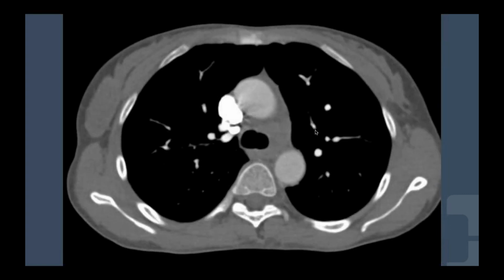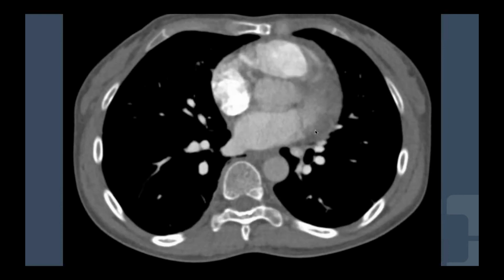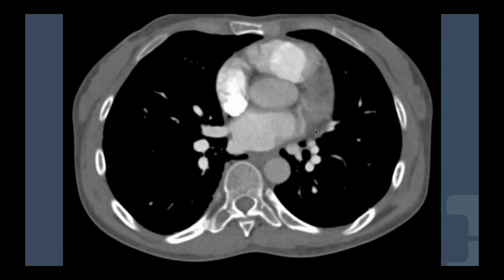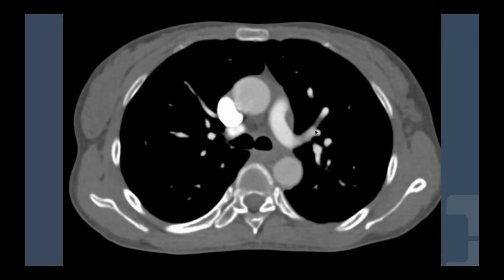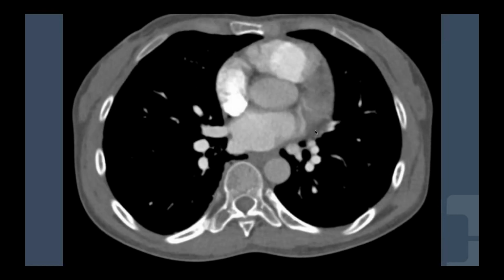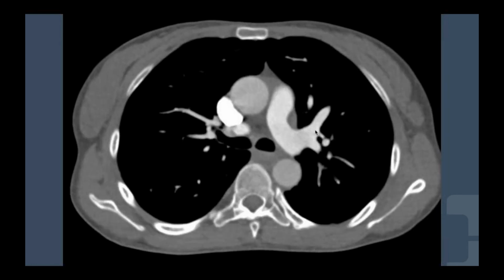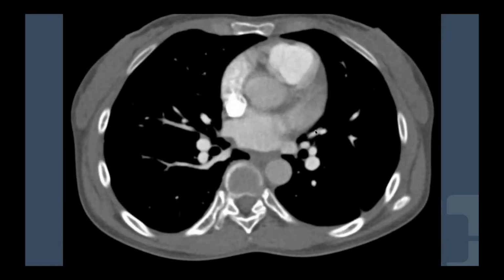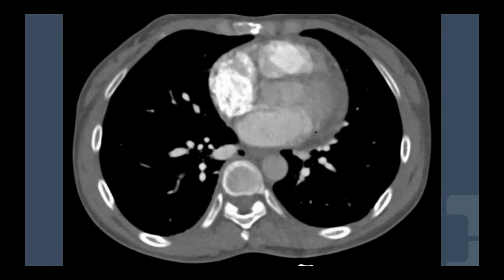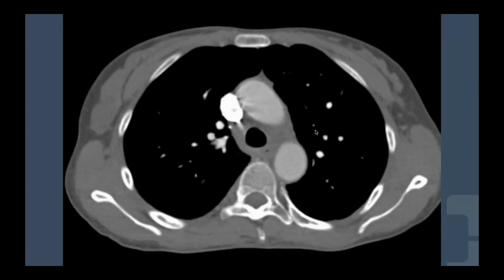I am trying to see. I want to show you one more case, but I really want to be able to display the full screen so that the movies will play accordingly. So let me do this. I think this way. Yeah, this is the way it should work. So let's see.